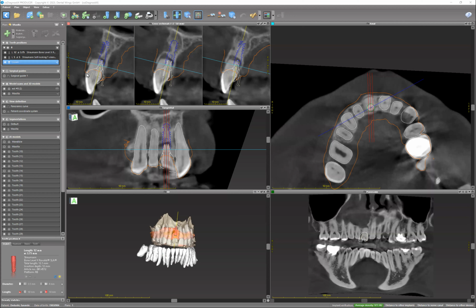If you remember this bump that I had here, I went back and I smoothed it, so it's now more of a subcritical contour. You can see it well-rounded, and that's about it. So with that, I am going to go back to Cares and move along the process.